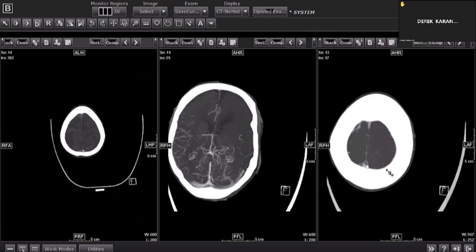Ian, what is that increased density in the venous phase due to? Is it because of the blood, what's causing that stasis? It's essentially backfilling. The arterial density of blood is just taking longer to get to that point. It's essentially stasis, or you could think of it as a visual representation of the delayed transit time.